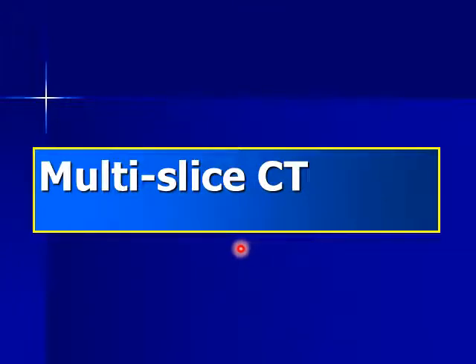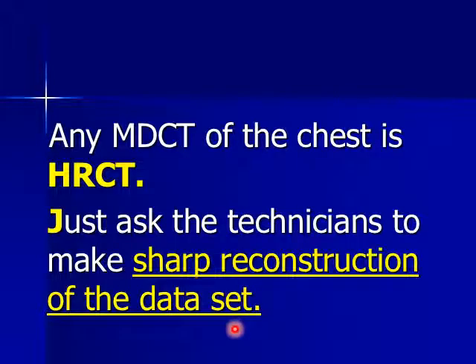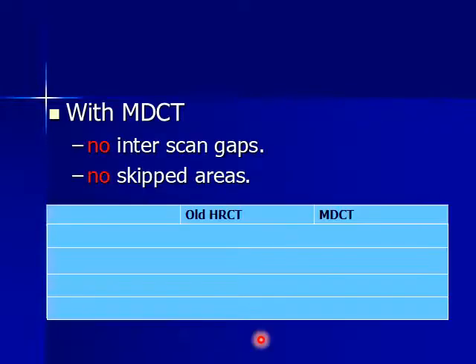Thanks to technology, we are living in the era of multi-detector or multi-slice CT. Now, any multi-detector CT of the chest is high resolution by itself. What you need is just to ask the technician to make a sharp reconstruction of the data set and send it to you on the workstation to do whatever you want regarding reconstructions, as we will see in a few seconds.